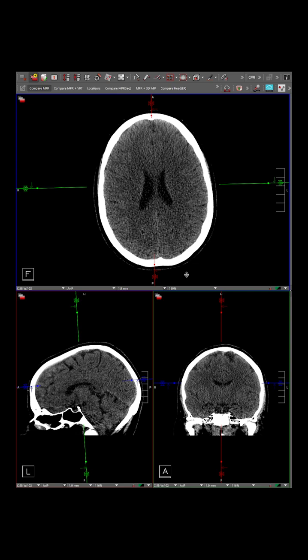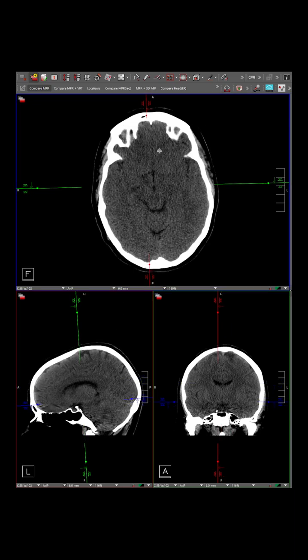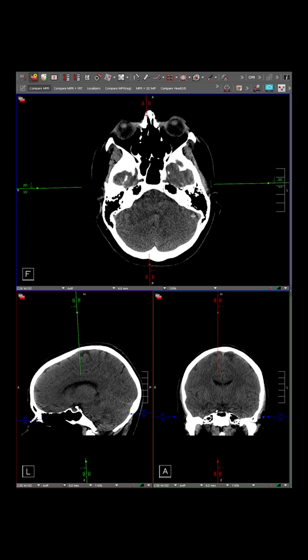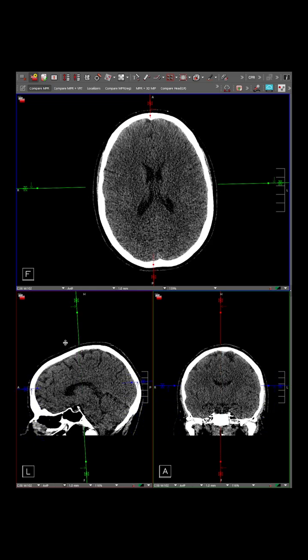And then Alt, and then you press down the mouse key and you drag the mouse. That's another way. So that's a very quick way. When that becomes muscle memory, it's so much more efficient. I'd recommend you leverage these tools. So break things into an MPR viewer, change the axes, and optimize the slice thickness for the area of anatomy you're interested in. I change it dynamically as I look at things.